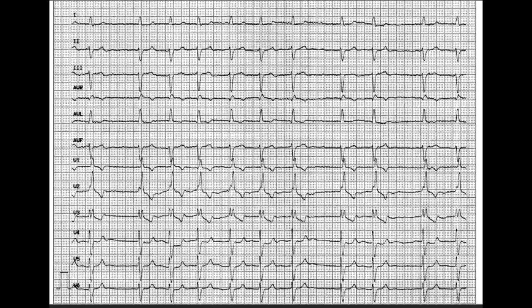So there might be something else that is decreasing the heart rate, because when we think of atrial fibrillation, we usually associate it with tachycardia. But here the rate is not low, it's normal, but it's low for atrial fibrillation. We suspect some kind of block. Keep in mind any block, maybe not really AV block because we cannot calculate the PQ interval, but it could be a branch block.